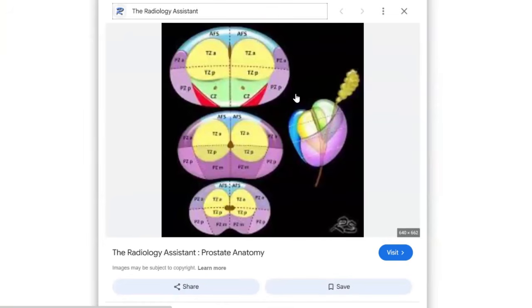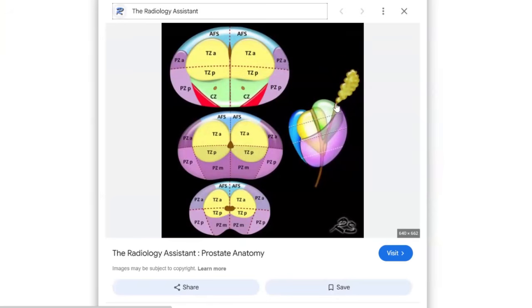Look here, my colleague, this is the prostate. The prostate is an inverted pyramidal shape. The apex is down, the base is up. It consists of the peripheral zone and the transitional zone, and this I think is the central zone. In BPH, the enlarged transitional zone causes atrophy of the central zone. Most of the malignancy, okay, this is an axial view, one here at the upper part, at the middle part, at the lower.